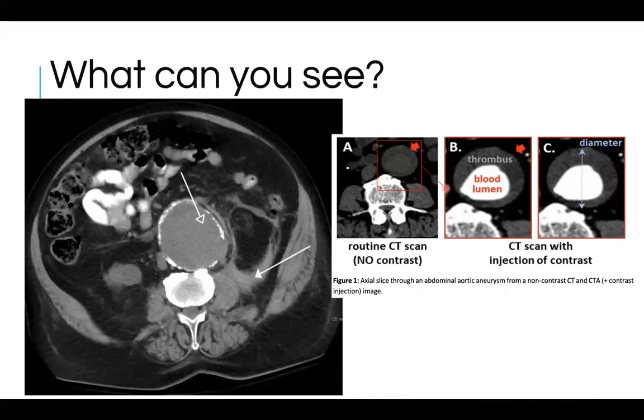This is something you could potentially get because it has devastating consequences. A clot. Okay. Yeah. So there's actually a ruptured AAA. So abdominal aortic aneurysm, which is ruptured. And you can see that there's a presence of blood. This is how we know it's ruptured. There's blood going into the retroperitoneal space.